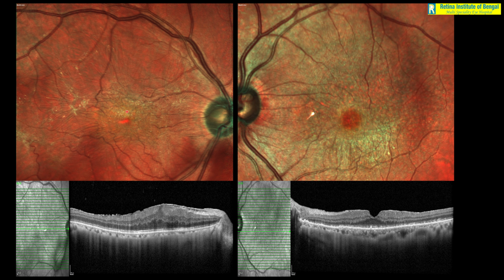In surgical retinal cases, also multicolor imaging can be very useful. For example, in epiretinal membrane, multicolor imaging has been found to be a wonderful tool. Not only it helps us pick up epiretinal membranes like this, you can see clearly the membrane, it stands out so prominently. You can see the entire extent of the membrane. Also, you can see this surface wrinkling. So not only can you see the entire membrane, you can also easily make out by just looking at the multicolor image whether the epiretinal membrane is impacting the fovea or not.